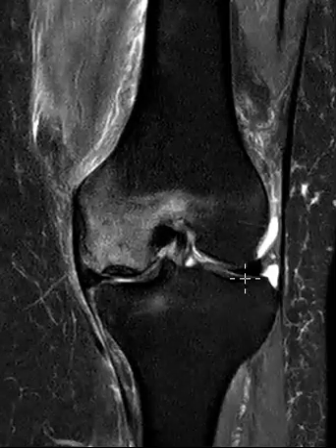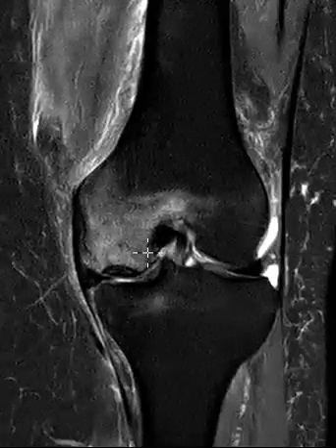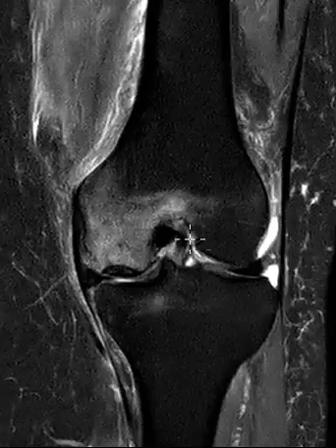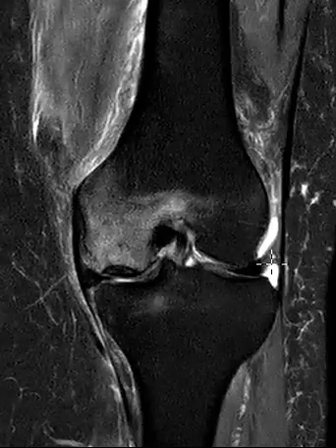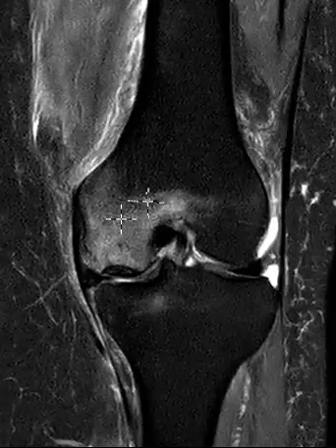This is a knee, working straight at the knee, and on this view we see there's bright signal. This is edema within the bone. This is the medial femoral condyle. Here's the lateral femoral condyle. The femur. Down here is the tibia, and we see a meniscus over here, a black wedge. Here's a meniscus to get oriented, and we see this abnormal finding that's pretty striking, lots of edema.